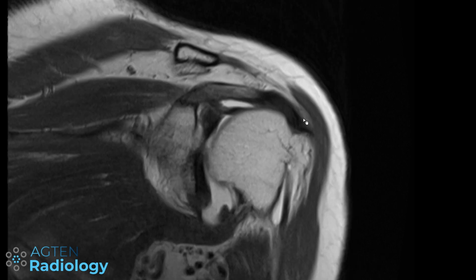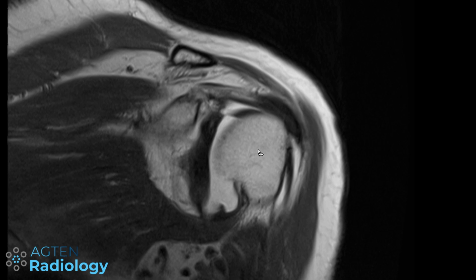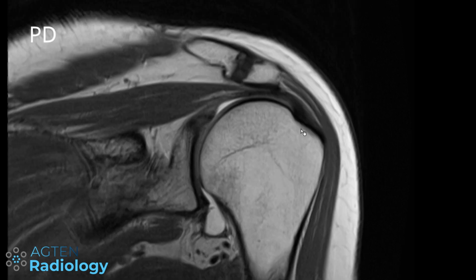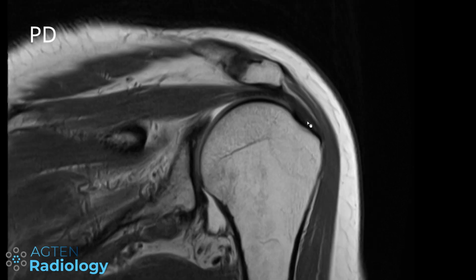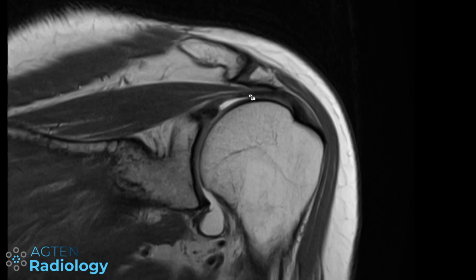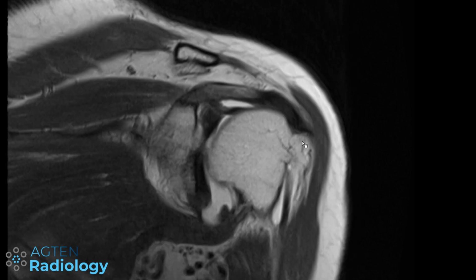So this one here is a nearly 70-year-old patient, and in older patients people tend to write tendinopathy just because of age. But look at this tendon here. It looks normal here in the front. This is the anterior facet of the supraspinatus tendon. Then we have the overlap, a little bit of signal here, which is probably due to the overlap. But if I scroll through, otherwise the tendon looks normal. We don't have a thickening of the tendon, and even the signal, I would just rate this as a normal tendon.